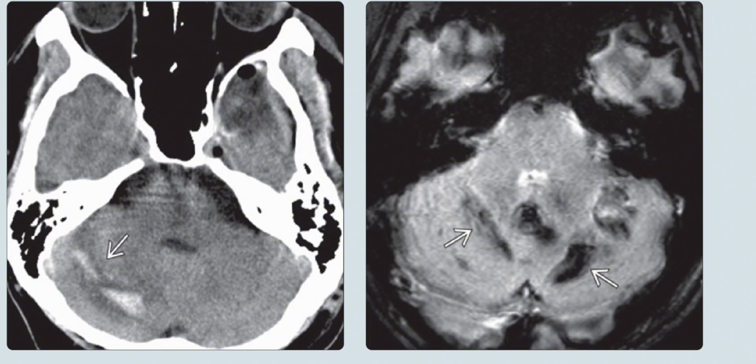Left image is the axial CT scan, and it shows acute hemorrhage in the right cerebellum related to remote cerebellar hemorrhage in a young patient who had a left temporal lobectomy. The etiology is thought to be related to CSF hypovolemia resulting in the inferior displacement of the cerebellum and secondary venous injury. Right is the axial GRE MRI in this cerebellar hemorrhage, and it shows the typical susceptibility artifact or blooming related to the recent hemorrhage. The hemorrhage may be unilateral or bilateral or isolated to the vermis.